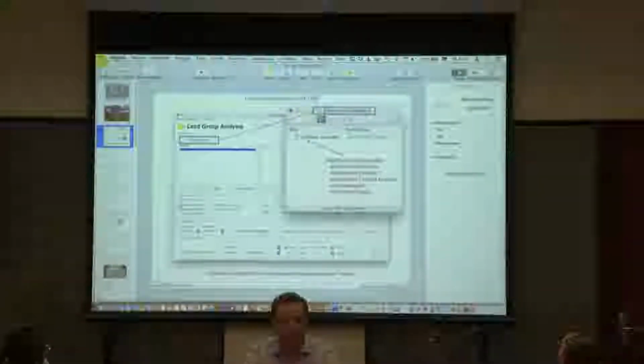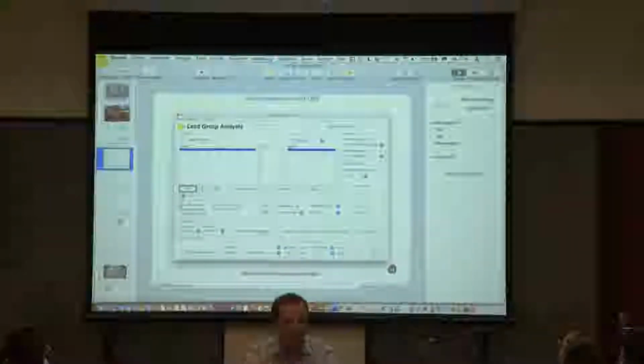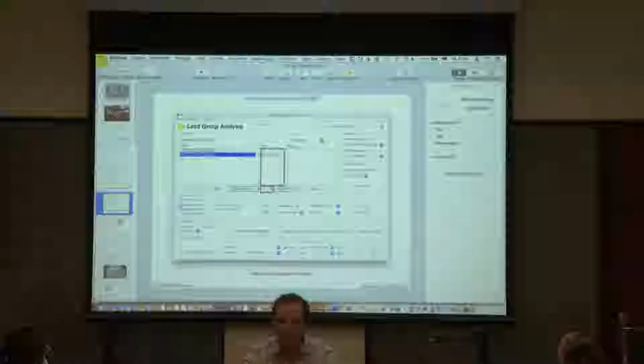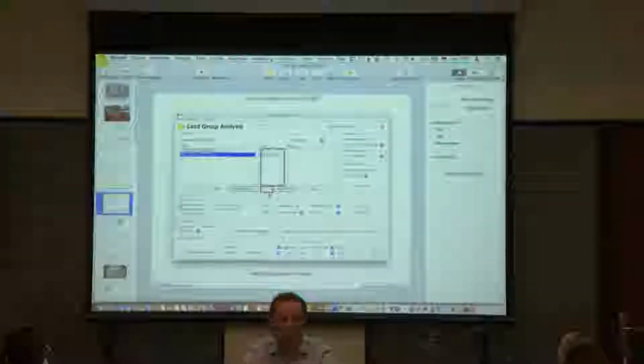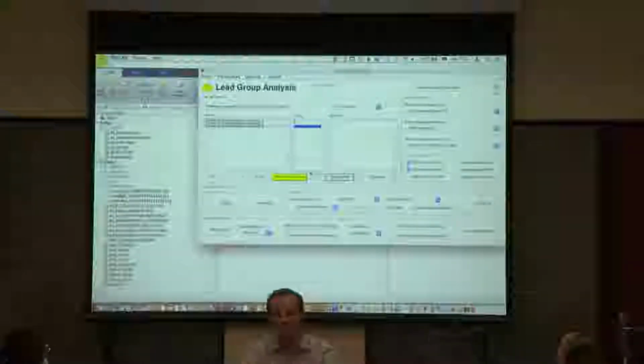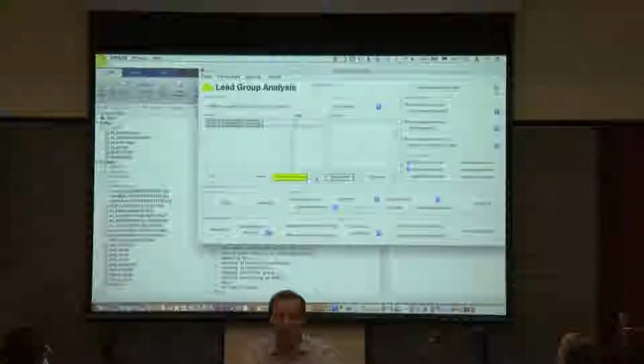And this describes it, right? Same thing here. We add the patients. We have 4 patients here, and then what we do in this tutorial is to add two different groups, so that we can do that as well. We can say this third patient is group number 2, right? We just click on the plus.